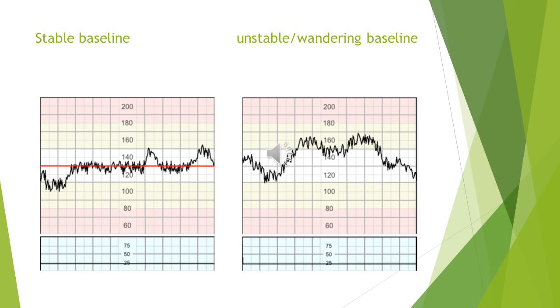I usually say that babies are very smart inside the womb, inside the uterus, and they are always whispering and sending us messages. These messages can be detected by CTG, so you have to be careful in picking out these messages, because your interpretation will affect the fetal well-being and the baby's health after that. So a wandering baseline is not normal, yet we don't need to act immediately. However, you need to be closely observing this baby and ask yourself why this happened.